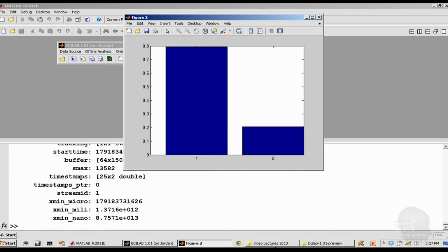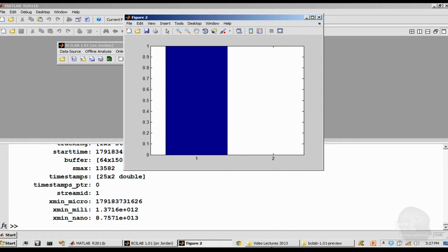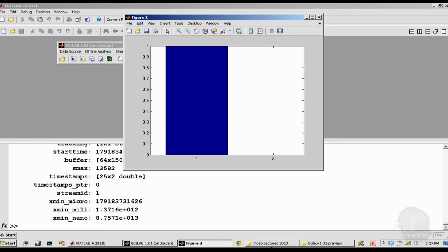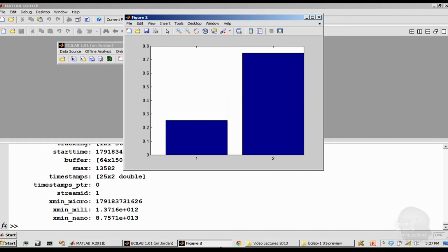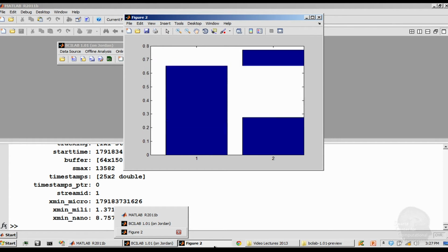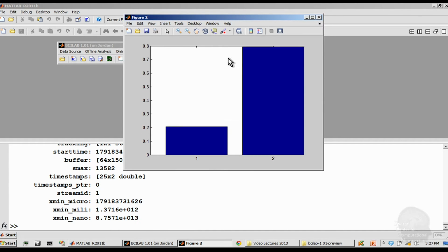So now what we see is the following. We see a bar diagram that indicates the probability that the person is in condition 1, which is no error, or that he is in the error condition. Since errors are rather infrequent, the second bar should only infrequently spike up, basically, and the first bar should be way more likely. But there's one thing here, and this model was trained relative to certain events in this experiment. In fact, right off the top of my head, I don't even know if it's button presses or stimulus presentations. I will have to look this up.